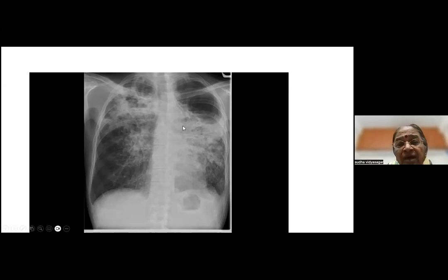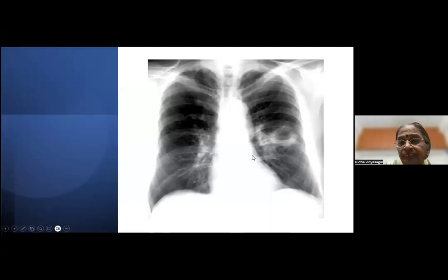If the patient doesn't have, even then, even if you call this a bulla, these are not explained by emphysema. There is fibrosis. There is cavitation. So fibrosis and cavitation together would be old pulmonary tuberculosis, even if it is there. Okay, fine. So remember that you must think of the presence of these things also in addition to whatever this was.